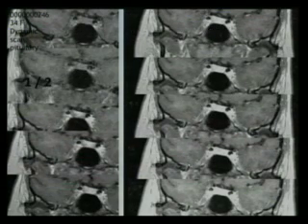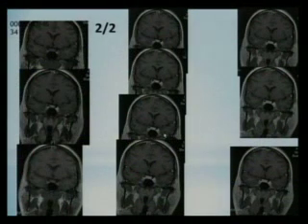And had this been allowed to go on a couple more minutes, then you would have seen the opposite washout phenomenon, where the tumor becomes brighter than the pituitary tissue. But this is called the dynamic scan of the pituitary. So again, to orient yourself, these are the source images, and what I just showed you were these focused shots.